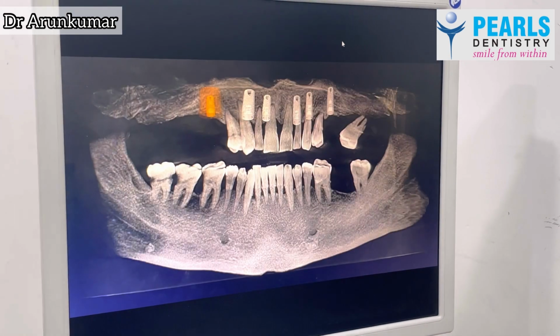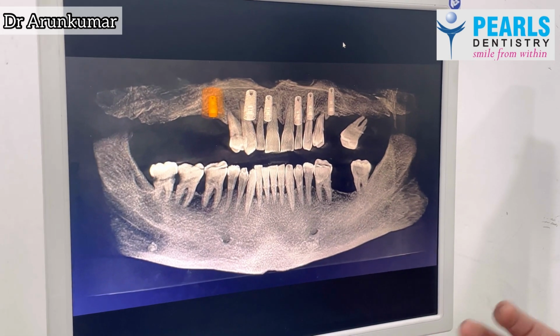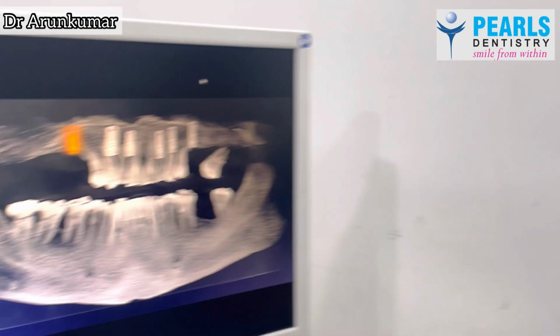So when we took a CT scan, the importance of the CT scan is manifold. One is, of course, it will help us to evaluate his bone and the teeth present in the bone. We can look at any infection that is there, any issues with the bone. We can measure the bone in terms of quantity, what is the length of bone available, what is the width of bone available. We can measure the bone in terms of quality, and so it gives us very real-time useful information about the condition of the patient's jaw and teeth that are present.